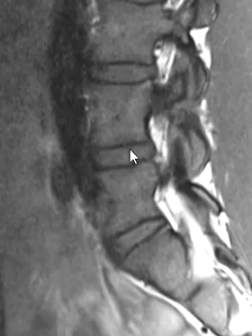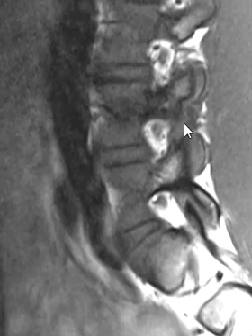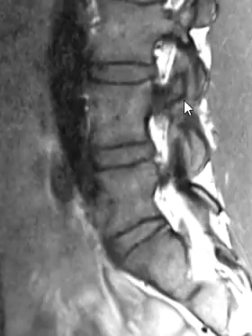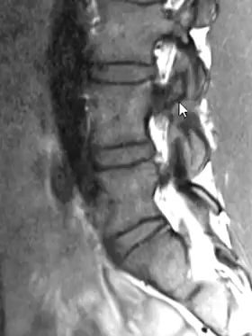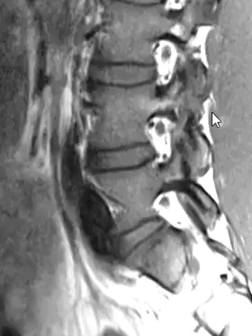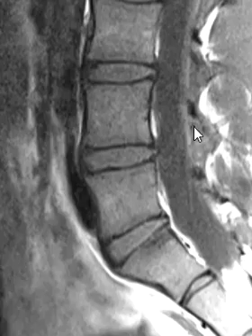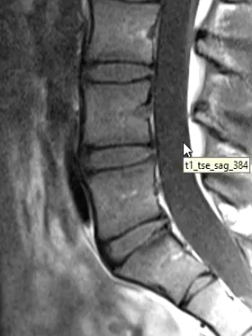This is another sequence where marrow looks a little bit different, and this is a pars defect on one side. Kind of foggy, hard to appreciate. There it is right here. This actually shows up much better. Right here is that pars fracture, and there's a little bit of bony separation. This is the bone, this is the bone. These should be touching each other. If we go off to the other side here, another little gap right here. So bilateral L5 pars defects and an otherwise normal lumbar spine.